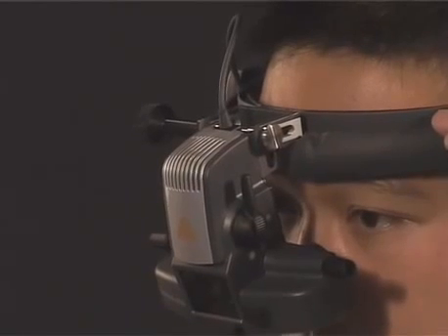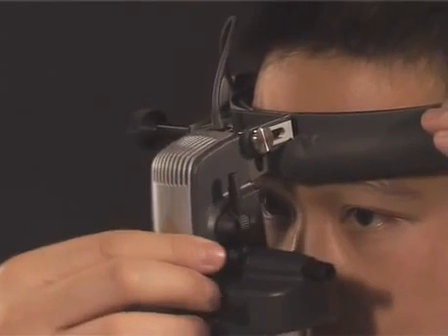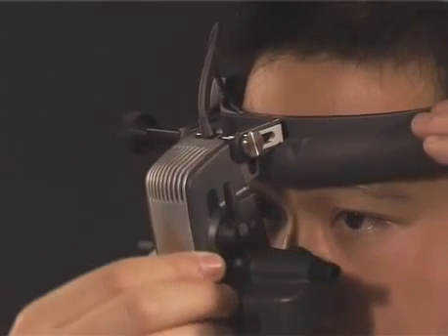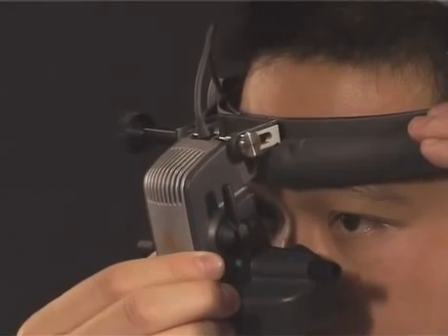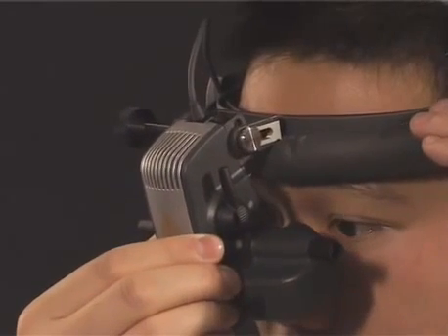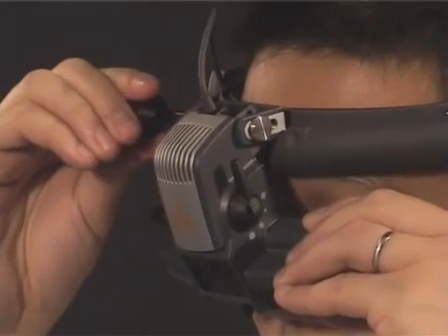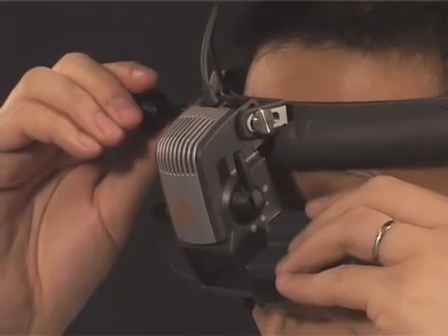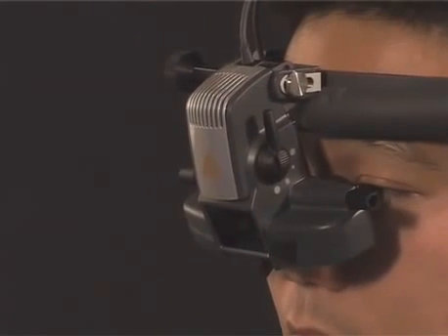With the instrument comfortably in place, you now need to adjust the position of the illumination and viewing system relative to your pupils. Firstly, bring the hinged body of the instrument as close to your eyes as possible, as this will give you the maximum field of view. Using the adjustment knob, both the height as well as the angulation of the optics are altered until the visual pathways are roughly in line with your pupils.